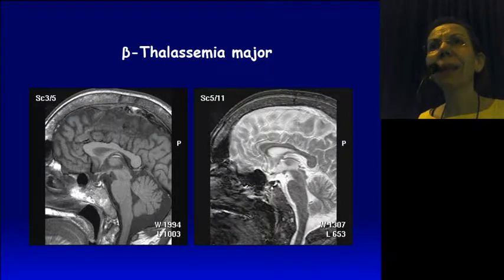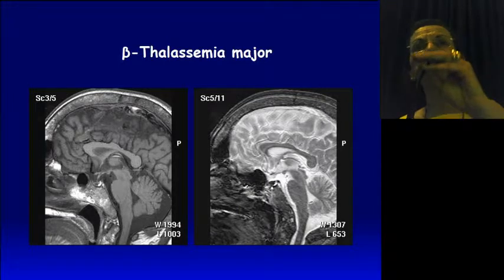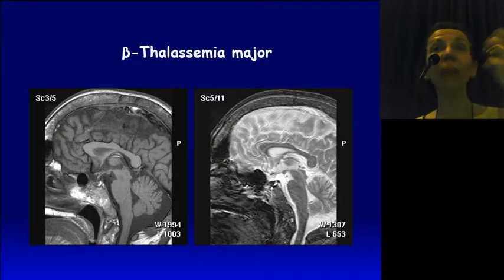And this is a T2 effect on T1 weighted sequences. You know that the signal intensity in different sequences is a balance between proton density, T1 and T2 times. And of course, by using T1 weighted sequences, you promote T1 effects. By using T2 weighted sequences, you promote T2 effects. If you see a T2 effect in a T1 weighted sequence, this is bad news. It means that there is a lot of something responsible for this T2 effect.